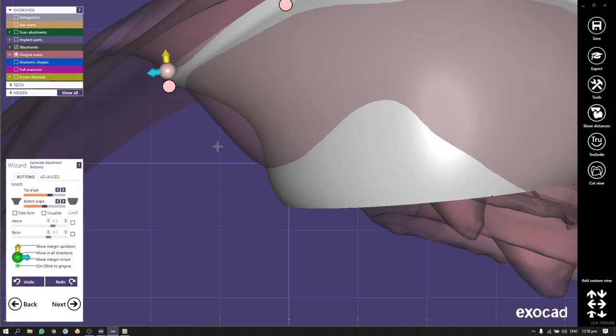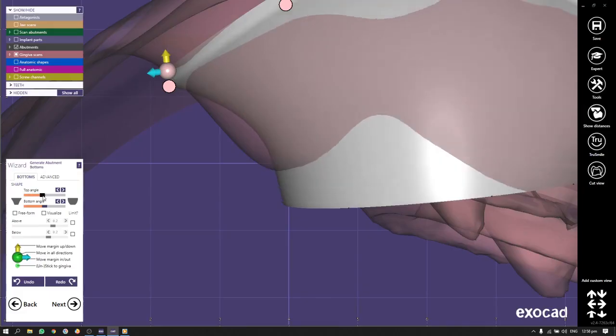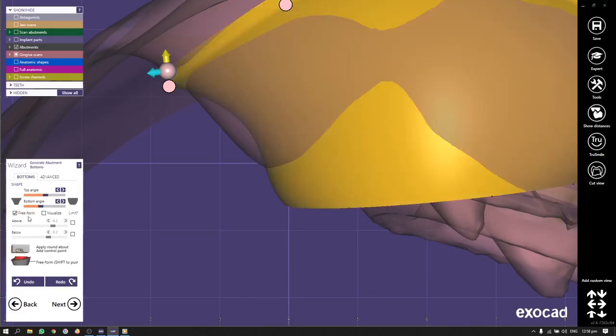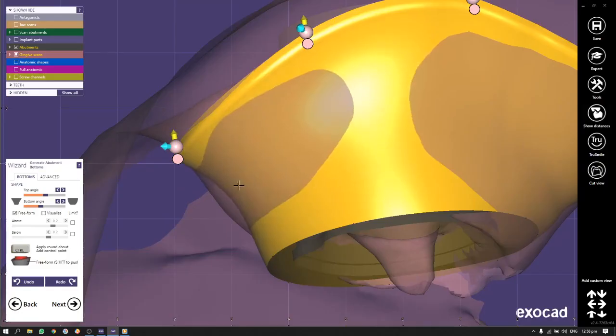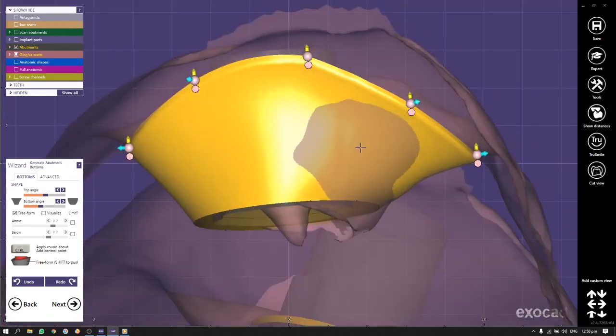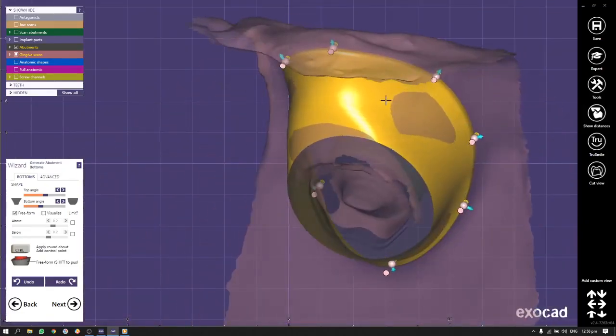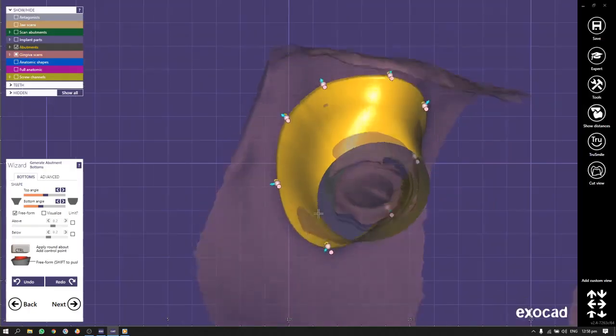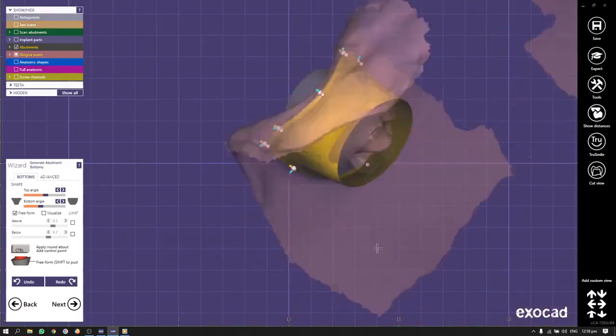To change the form, we have two scroll lines, which we can move, or we can place a tick in the box free form with the left mouse button, and with clicks we can create pressure in certain areas. With a shift I can remove or add. Deliberately the program adds with big areas, not like during the design of the tooth. It is done just not to create undercuts in this zone.